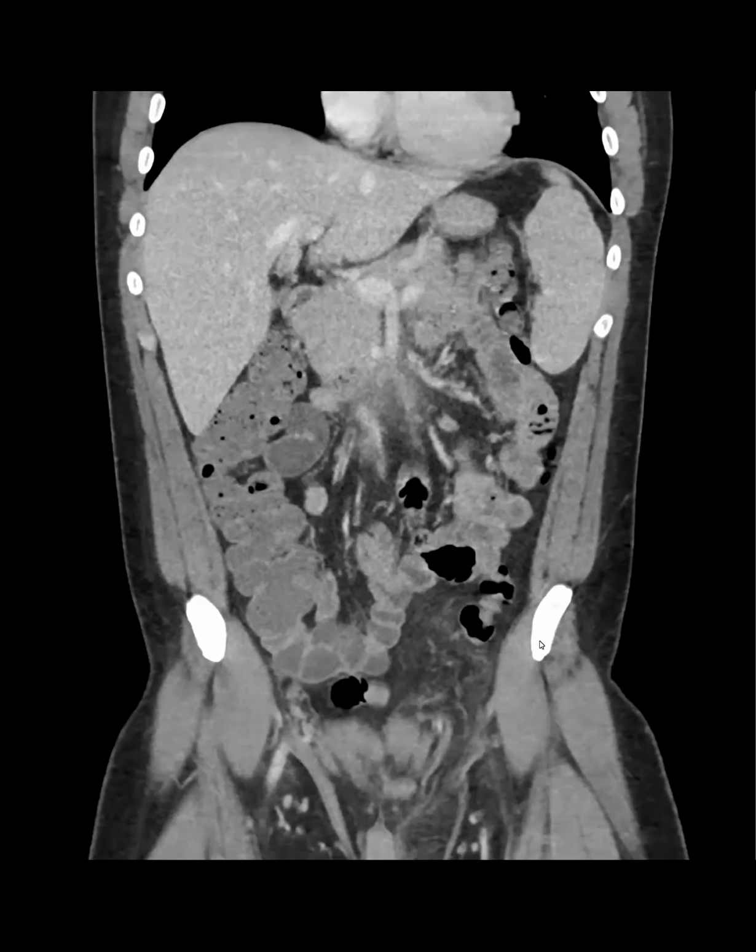And I think here, maybe you can see that it's a raised thing. See that? To the skin, super subtle. See that? Super subtle. Oh, I don't think it's callable at all. I mean, again, if somebody would have called this, that would be the call of a decade, I think.